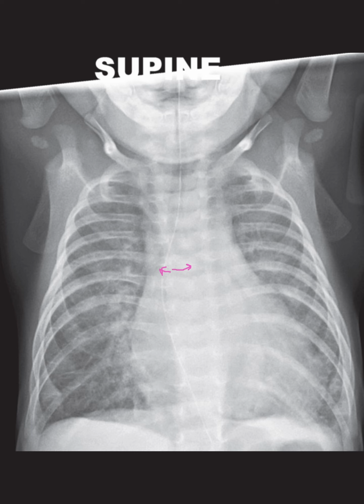In summary, this case highlights the importance of a thorough evaluation of chest radiographs in infants, especially considering potential congenital heart diseases. The findings here suggest a complex cardiac condition that warrants further investigation with echocardiography and possible interventions.